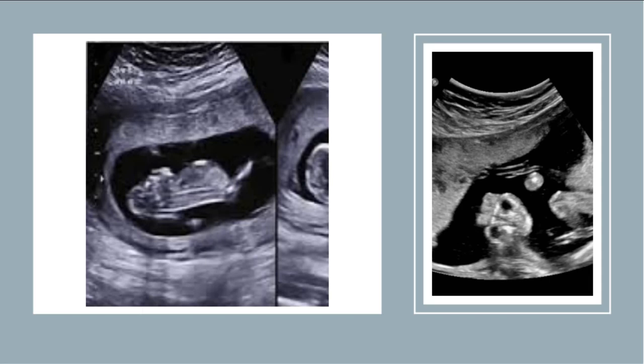So image on the right-hand side, this is that coronal slice of the baby's face. You can see the orbits are pretty abnormal looking, but they're pretty prominent as well. So they do have some facial structures that had developed. We do see a tiny bit of cerebral tissue here coming off of the base of the baby's head, but again, we're not seeing any sort of cranial bones.